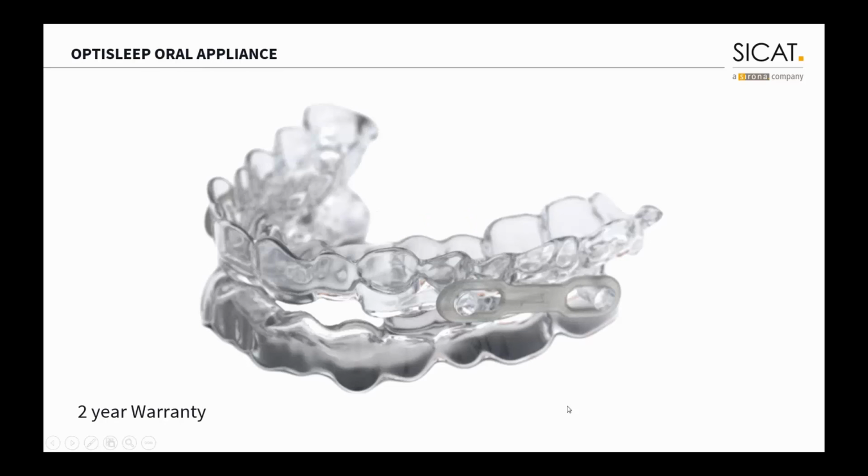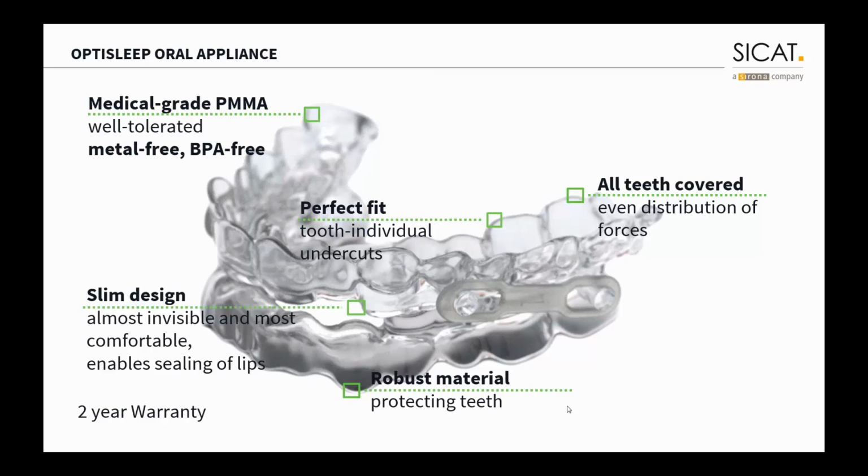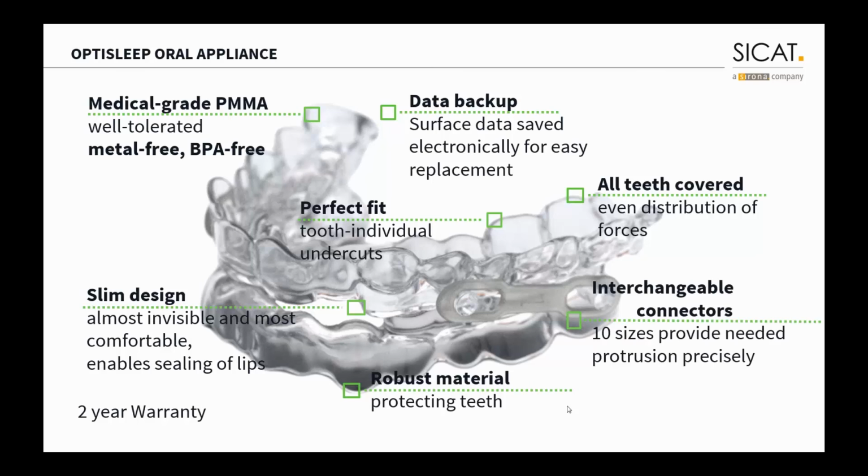It has a 2-year warranty. All teeth are covered, and again, your CEREC scan has to be really accurate. Perfect fit if your CEREC scan was accurate. It's a strong material, medical grade PMMA, slim design. It's very comfortable. The feedback we get from our patients is they almost don't feel it. You always have the data backup, just in case you lose it. And it comes with 10 sizes of interchangeable connectors here. So just in case the jaw of the patient is too much protruded, you can always exchange it to a larger connector, so it gives the patient a little bit of relief.